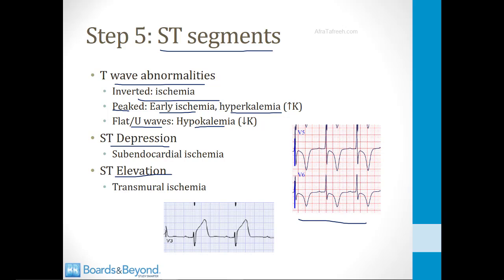There's some ST depression in this ECG on the screen here. This is the beginning of the ST segment. This is where it ends, and you can see that it's depressed. At the bottom of the screen is an example of ST elevation. These are both signs of ischemia that I discuss in more detail in the ischemia basics video.